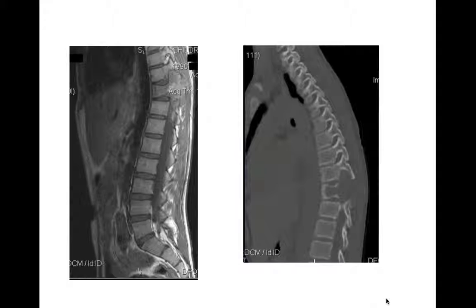Okay, this was another aneurysmal bone cyst in this case, which extended from the vertebral body into the posterior elements. A nice example on the sagittal CT and on the MR, which on the MR, it's hard to say anything smart about it. You're just going off its location. You don't see any fluid levels here to tip you to an ABC or a giant cell tumor, but this one ended up being another aneurysmal bone cyst. This is just the axial showing you the same thing.